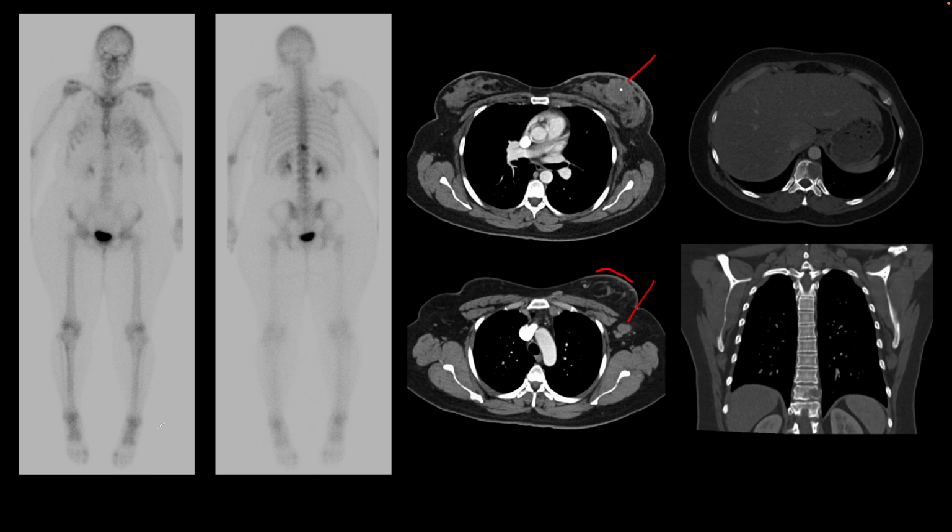When we look at their whole body bone scan in the anterior and the posterior projections, we find that there is increased soft tissue uptake in the left breast. That happens because of hyperemia when there is a tumor. And their scan shows this single or solitary focus of increased uptake involving the T11 vertebral body. And on their CT scan, we find that in that location, there is a lytic bone lesion seen here on the axial and the coronal image.